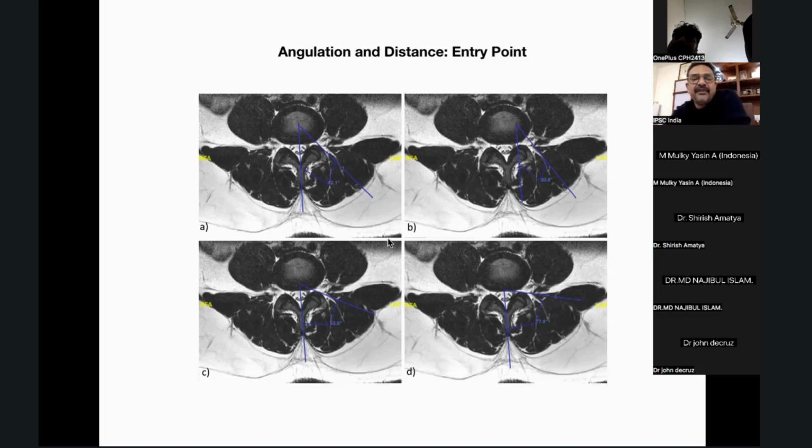It's just a rough guidance where we can identify that if we have to go for the posterior annulus, you can see here, we have to go a little lateral, more lateral. And this also gives us confidence that yes, this is a trajectory. If I take this trajectory, I will be avoiding the retroperitoneal space, and I can be targeting my fragment.